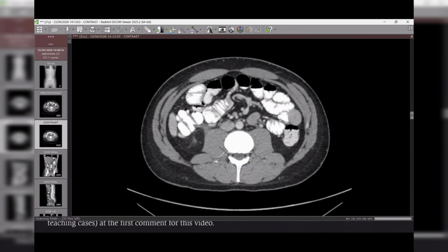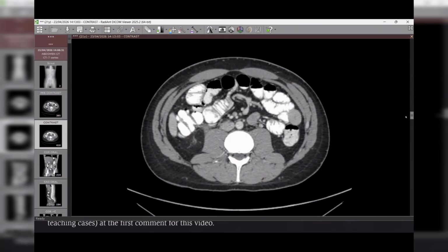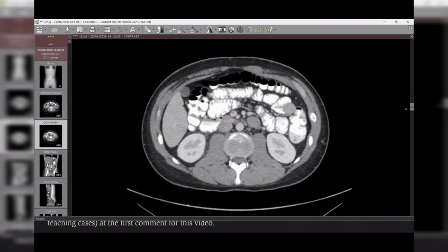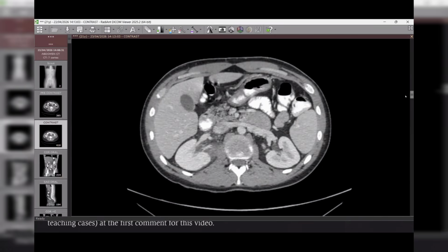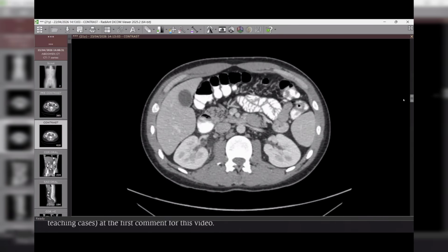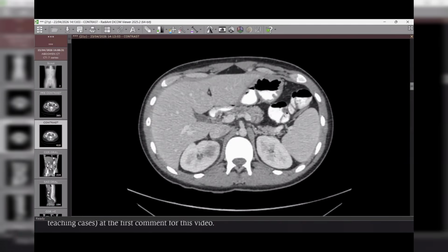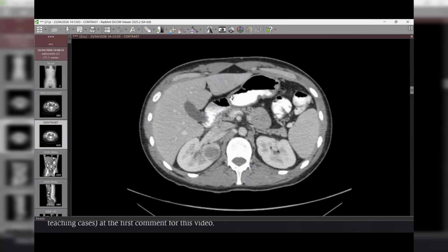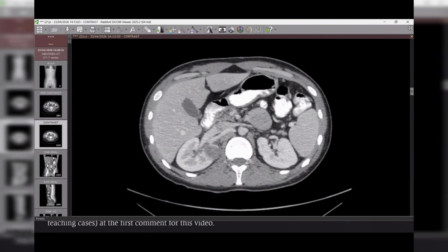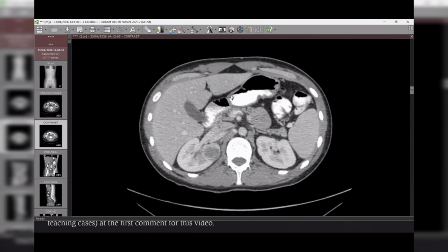Can you ignore this mass for a little bit? We will see this one in the coronal plane. I want to focus again on the mass in the right kidney. You told me that this may be infectious disease because we have smudging of the fat planes and the clinical presentation of fever. I totally agree. But is this lesion starting to localize and liquefy or not? Yes, it starts to localize. So acute pyelonephritis, but it could localize. It could be a renal abscess. It's not yet a renal abscess, but it's going to form one.